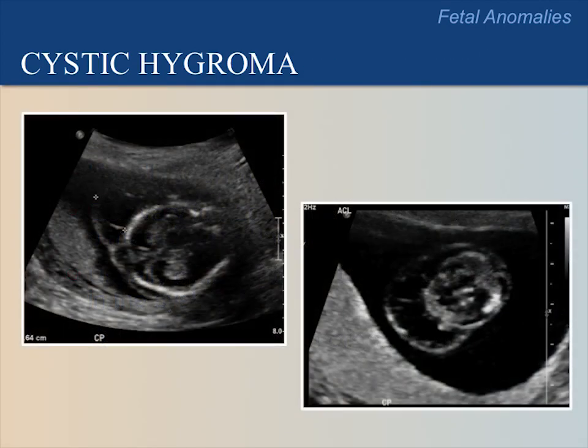These images show cystic hygromas behind the head. Please pause the video now to have participants point out the cystic hygroma and associated features.